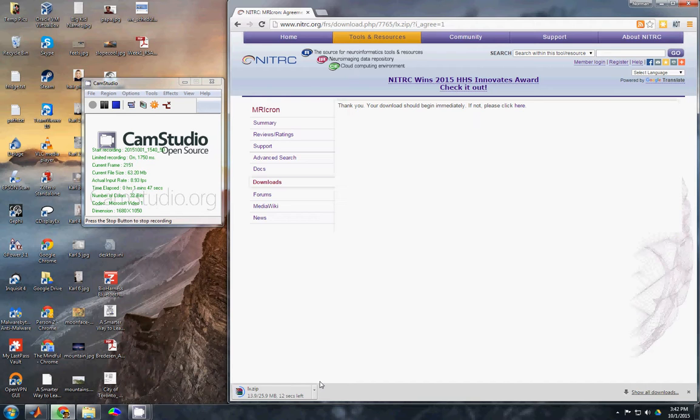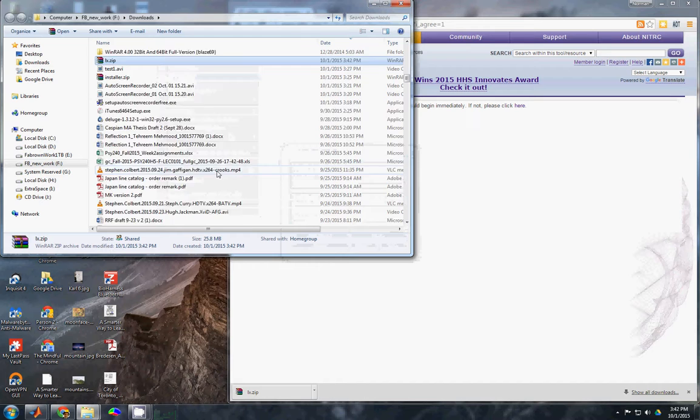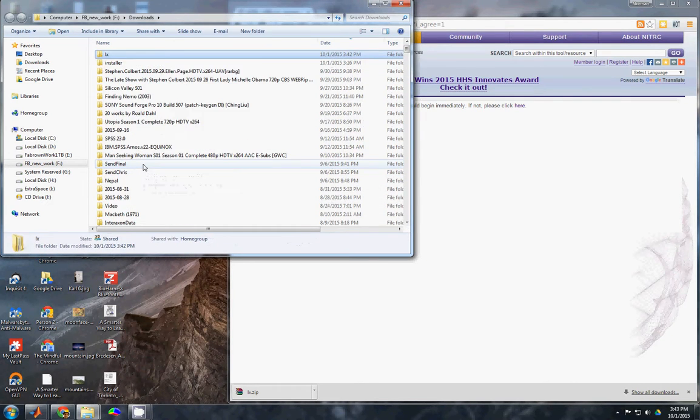until we have the full program, and it actually comes with a few different bits of software, including stuff to convert brain image files and so on and so forth, but we're just going to use the main MRI-cron program. So once you have it downloaded, you can extract it into a folder somewhere. I guess I might as well just do it from scratch so I can make sure nothing's changed with new versions. So I've extracted this lx.zip.